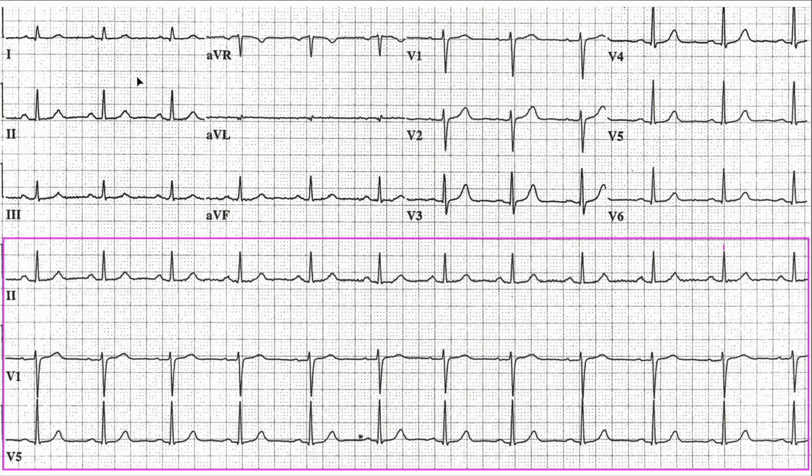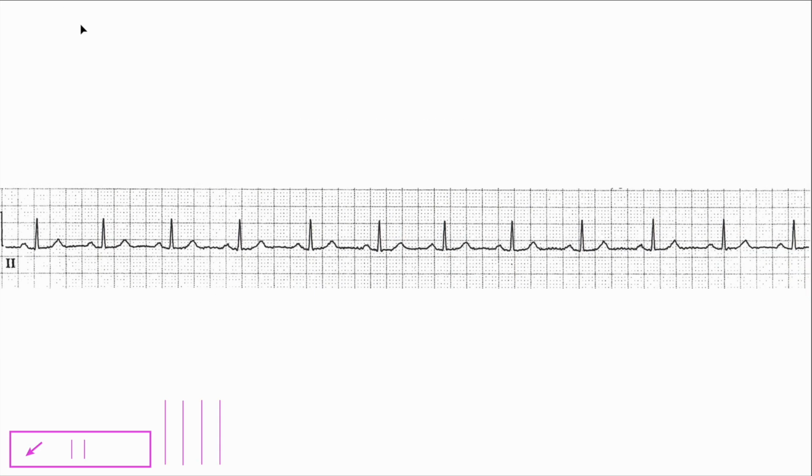We'll be breaking it down step by step, what we're doing, why we're doing it. We'll be going into the methods and the reasons of what it is that we're doing as we're approaching this ECG. Now, let's get into this rapid ECG interpretation.